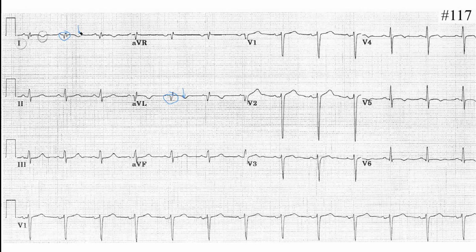Yes, but what kind of MI is this? Lateral. High lateral, and which phase? It's a few weeks old probably. Yes, that's subacute, high lateral, and nothing else, no hypertrophy, and the normal width of the QRS. So that's it. Nothing else. All right. Professor? Good. Yes.